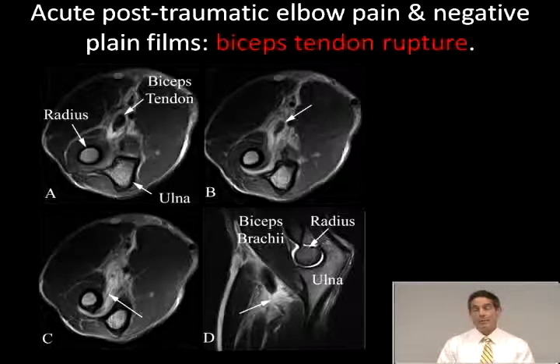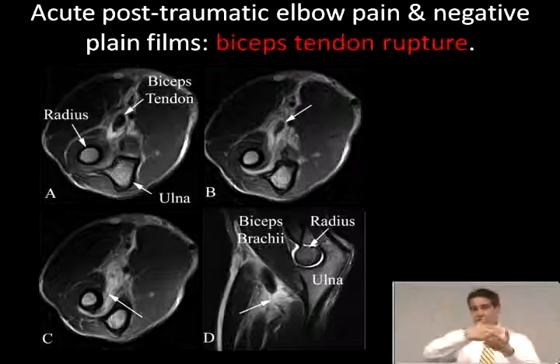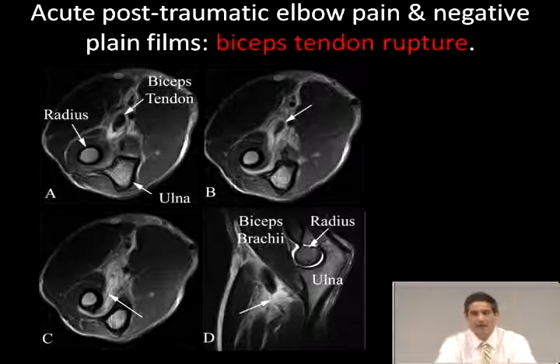Of course, the full MR exam is going to include lots and lots of pictures, slicing all the way through this in all three different directions, and showing you all the muscle edema and all those other findings that can help diagnose a biceps tendon tear. Also, biceps tendon tears are typically fairly clinically obvious with a balled-up Popeye muscle in the arm and no biceps tendon palpable distally. A lot of times these patients are sent for imaging for confirmation of what's already a highly suspected injury, or for measurement of that gap, or to see what kind of muscle you have.